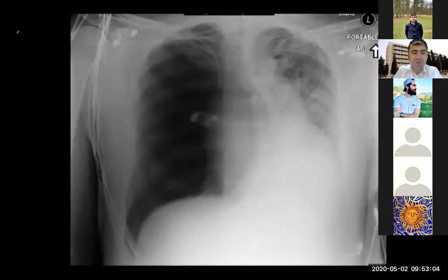So you mentioned C, which is cardiac shadow, cardiac silhouette, and the mediastinum. Do you think there is any problem within the mediastinum? Yes, they are not marked and do not appear well.